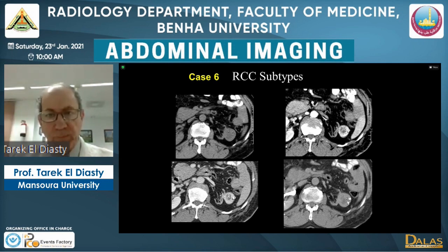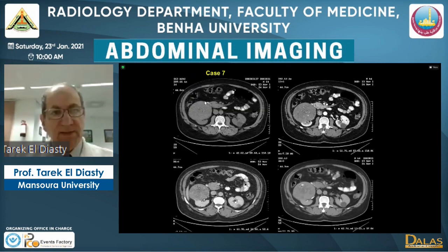So what are the tumor characteristics of this lesion? Which tumor shows this enhancement characteristic? This is the clear cell renal cell carcinoma: significant or avid post-contrast enhancement in the early phase and significant washout thereafter. What about the pattern of enhancement of this tumor?